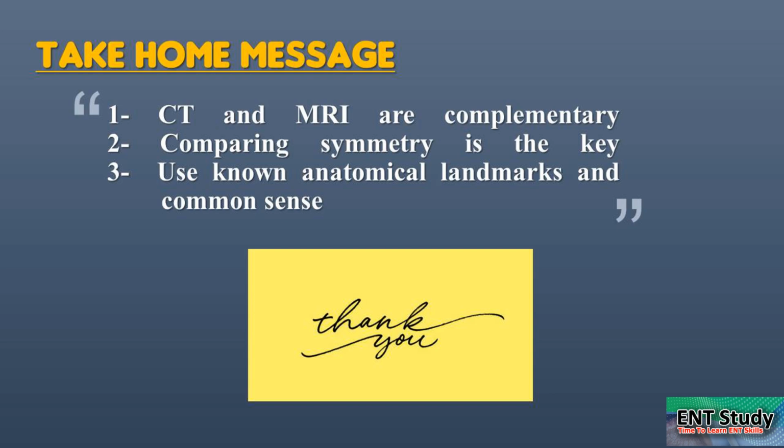But CT, because it's quick, helps overcome the movement, swallowing and breathing artifacts. Comparing symmetry is the key. And please always use known anatomical landmarks and common sense. Thank you.